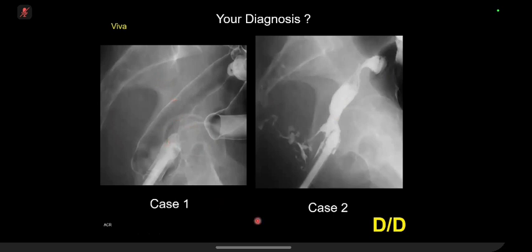So it's a single spot image, lateral view of the barium enema with the Foley's in situ. There is a kind of featureless appearance of the rectum, that I think is what I can see. I cannot see any polyp or any mass or any constriction on this single spot image.